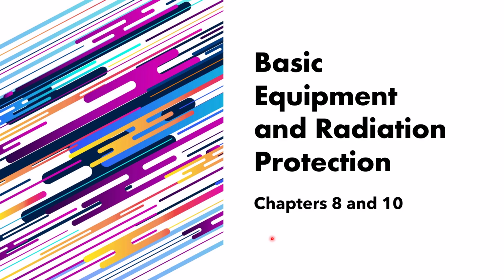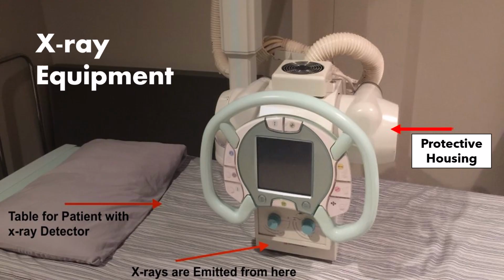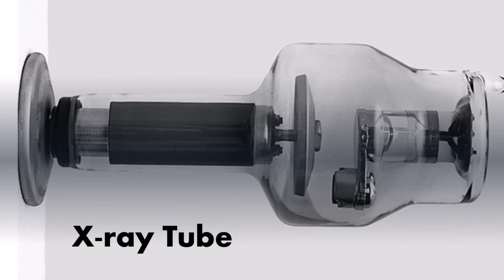This lecture is basically from chapters 8 and 10, and it's going to be self-evident that you've seen it in our lab and in the x-ray rooms. So this is basic x-ray equipment and the x-ray tube head that you've seen in lab already. We will go over some of the parts.